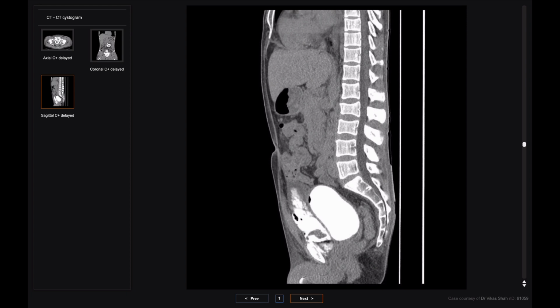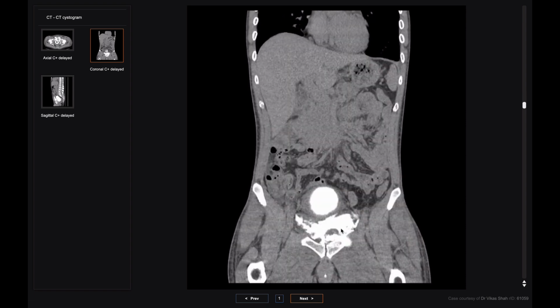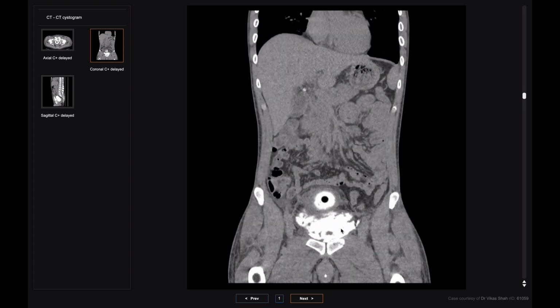With an intraperitoneal bladder rupture, what you'd see is that the contrast would have entered the peritoneal space and would be outlining all of these bowel loops, but it's all contained here in the tissues anterior. So it's enabled us to make that diagnosis far more confidently than without administering that contrast into the urinary bladder, and then the appropriate management steps can then be undertaken.